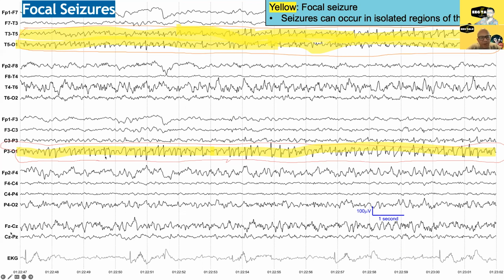So at the beginning, on the left-hand side of this, it's really theta waves. They're not too spiky. And then as you go toward the right, as it progresses, you see most of the peaks of these waves are epileptiform, right? So it has epileptiform discharge. So there's this evolution of the morphology, but it really stays focused on the left side, the left posterior quadrant. Yeah. So it's a focal seizure. There's probably something wrong back in the left occipital area. Maybe it could be a tumor or a stroke or an infection or an injury back there.